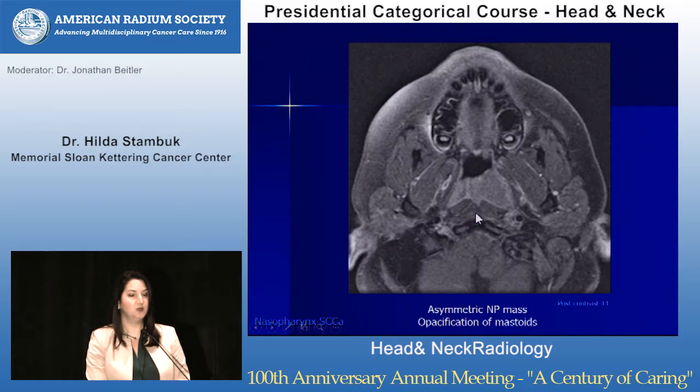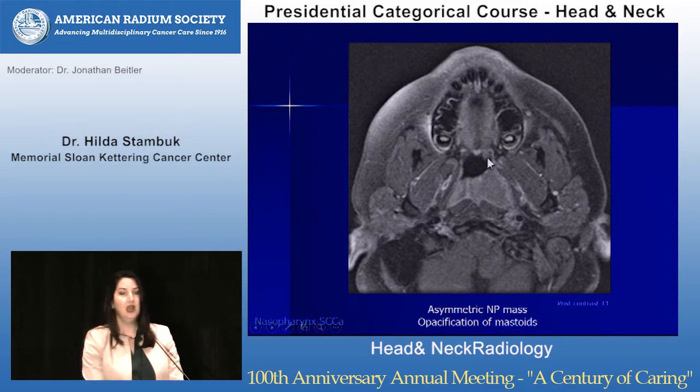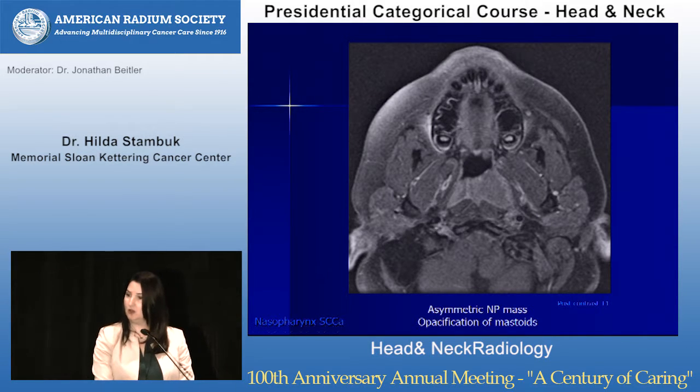There's a lot of spread patterns, but instead of showing you the words, we're going to go through various images. So this is a young patient. This is like an 11 or 12-year-old patient with nasopharyngeal carcinoma, which doesn't seem real, right? But I wanted to remind everybody, even though nasopharyngeal carcinoma is primarily an adult disease, it can be seen in adolescence, as you can see in this patient.